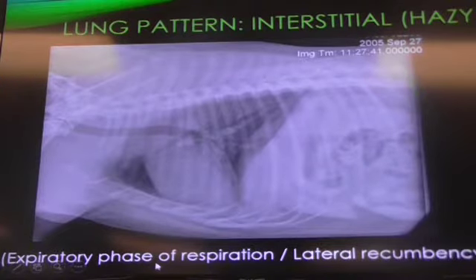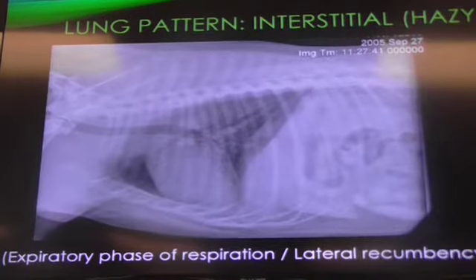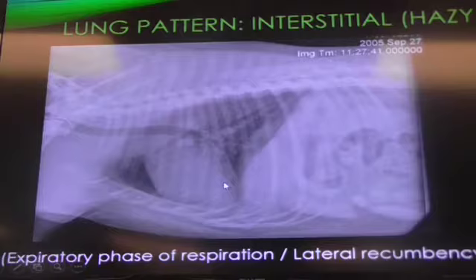Or you also have to check if you are capturing the radiograph during inspiration or expiration. If it was captured during expiration, that can cause the appearance of increased opacity. Okay? So how do I know this is expiration? It's the diaphragm. Yep, good job. If you see increased space between the caudal margin of the heart and the diaphragm, that's usually inspiration.